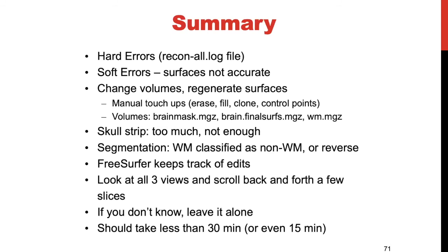For hard failures, check your recon-all.log file. That is a pretty clear indication of whether or not you have a hard failure. For soft errors, your surfaces are the ones being affected. But although your surfaces are affected, don't edit your surfaces. Instead, edit your volumes and then run the specific recon-all commands, and FreeSurfer will regenerate those surfaces.